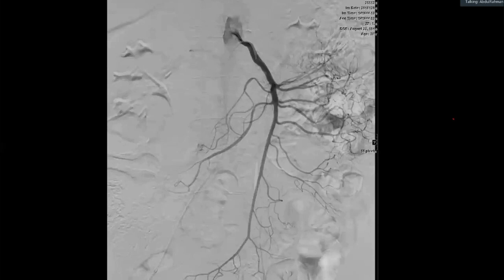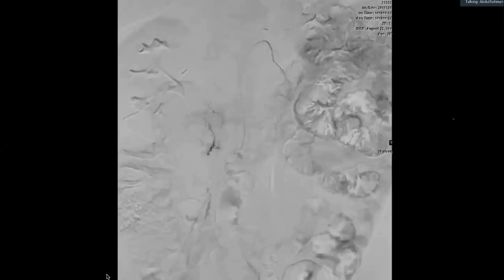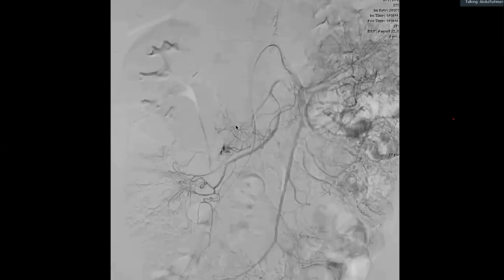There are many ways that bleeding manifests on an angiogram, but let's just stick to this: active contrast extravasation. Remember this picture. You can see that the contrast is not in some kind of anatomical vessel plane. This is certainly not bowel. You can see the bowel gas outline here, and you really don't see anything constant.